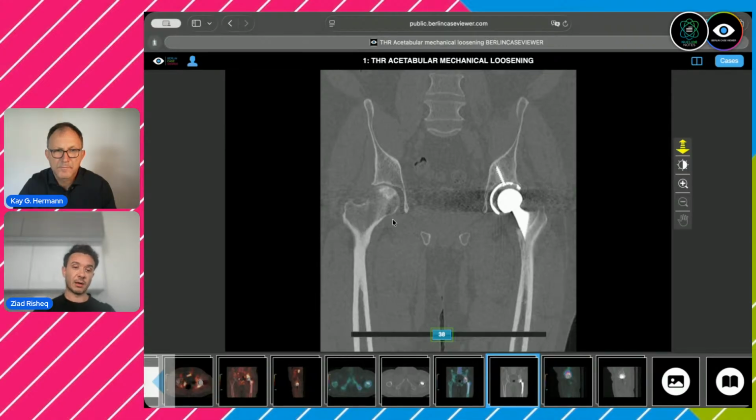When do we see uptake around avascular necrosis? When there is subchondral fracture. When we're in stage 3, when there is subchondral fracture, regardless if it's more than 2 millimeter or less than 2 millimeter, this is when we usually see the uptake. In stage 2 and stage 1, we can see uptake, but usually we see photopenia around this region and a peripheral rim of uptake. But we don't really need to see this unless there is a reparative phase.